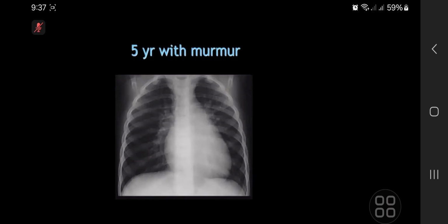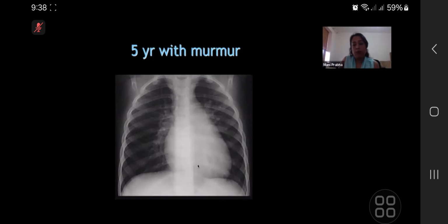So a slightly older child with mild cardiomegaly and shunt vascularity. Given the age, this is probably an ASD rather than a VSD or a PDA. I can't see any rib notching or anything else that would make me think of those. Fantastic. Let me sum up the findings now.